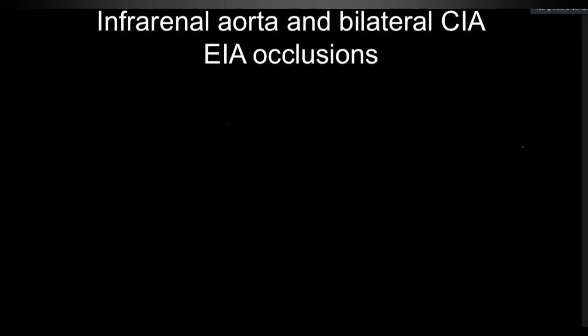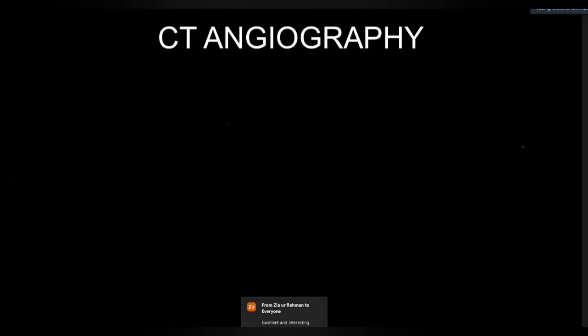So again, coming back to what I said in the original slide, what is this study? So this is a CT angiogram, and this was done for obviously distal peripheral vascular disease. Leriche syndrome could have been one of them because both the internal iliac arteries are also occluded. So it's to determine what the anatomy is, what the study is, knowing the branches of the aorta, knowing what the normal aorta looks like to differentiate from an aneurysm. And when you don't see contrast on an arterial phase study in an artery, it is occluded. I want you to use the word occlusion rather than thrombus.